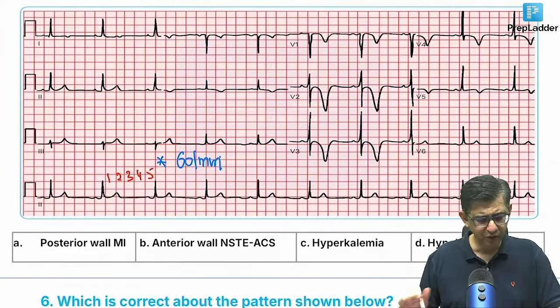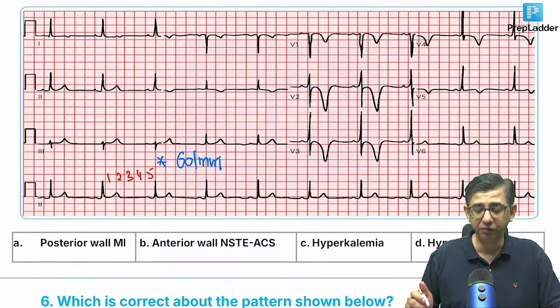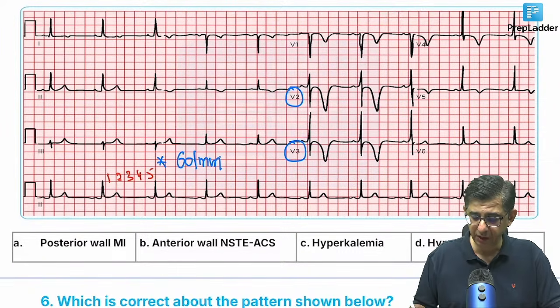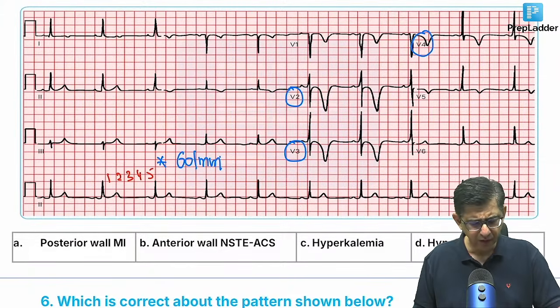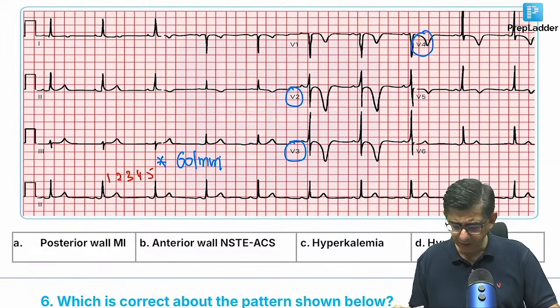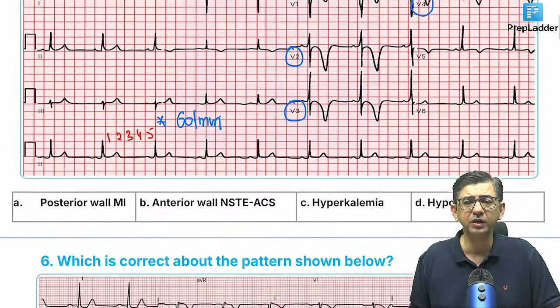The axis also does not show very significant changes, but you can notice very characteristic, very symmetrical T-wave inversions that are present even in V1, but then in V2, V3, and even V4, they are very prominent ones. So you can hit the comment button with respect to this: what would be the interpretation in this case? There is hypokalemia that is coming up in the discussion. Good one. In hypokalemia, there is bound to be other changes also present.